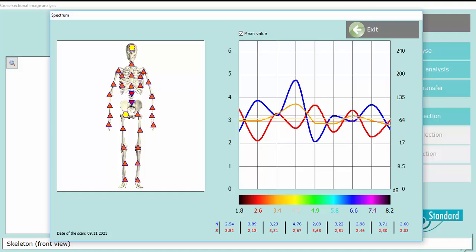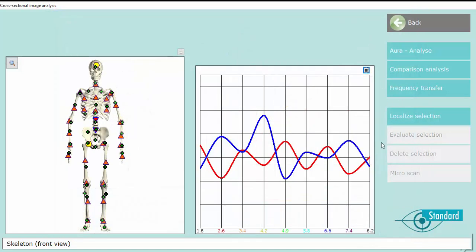These are the mucous membranes, especially in the gastrointestinal tract. If you move the mouse over the value 4.2, you will see that text for the corresponding structures now also appears. You can also see text for the corresponding structures in the main curve image by moving the mouse over the corresponding values. You don't have to click, just move the mouse over the corresponding value and then you will see in the window that appears underneath which structure it refers to.